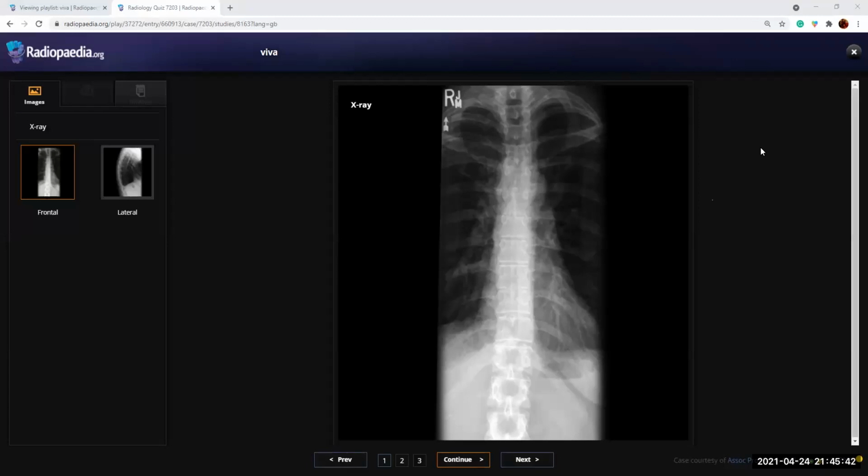Now, this could have a differential from a destructive lesion by infection like tuberculosis. However, metastatic lesions like neoplastic lesions can also produce this picture. I would discuss the findings with the clinician and ask if this patient has any acute symptoms of fever, and advise to further take this X-ray with the contrast enhanced MRI of the dorsal spine.